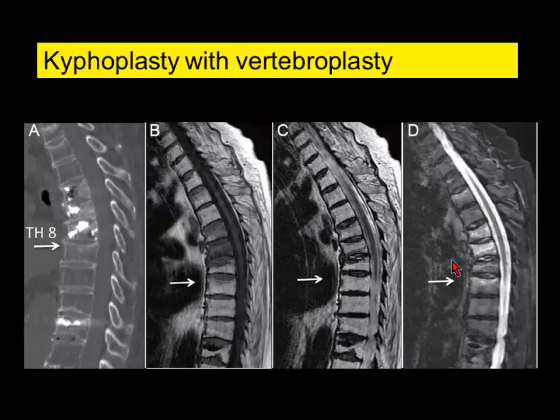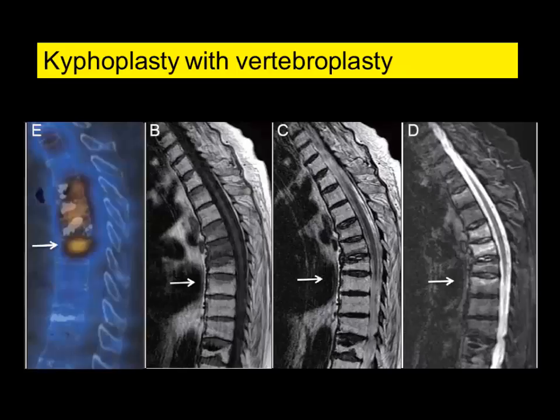But now, what is the solution? Some of these patients had vertebroplasty, and this one is a compression, superior end plate compression fracture with sclerosis of the superior end plate. This patient was referred and had the SPECT. So this is the acute fracture. The rest are not acute, they are chronic. And this vertebroplasty, which was recent and is showing inflammatory changes, this is the likely cause of the pain.